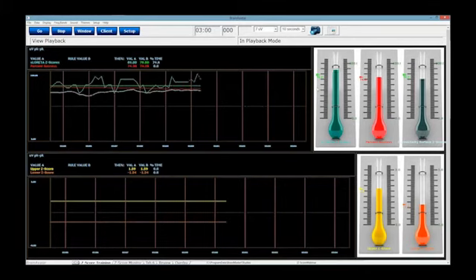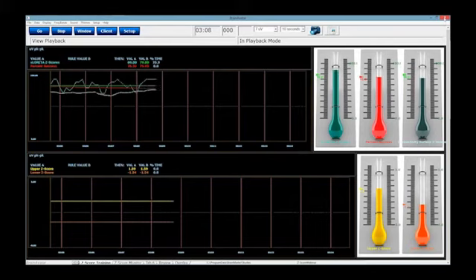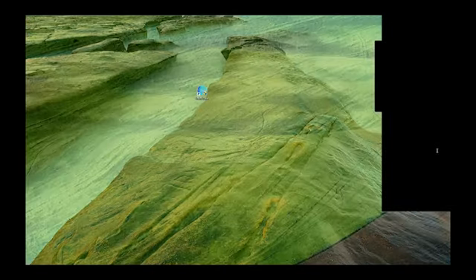C is usually your constant control for a percentage of Z-scores, or at least if you have percents of Z-scores on it. If you do not, then you just have to worry about your upper and lower and getting it within that range. Whenever you do a change, make sure you double check. And that's really the only thing I have to say on that.